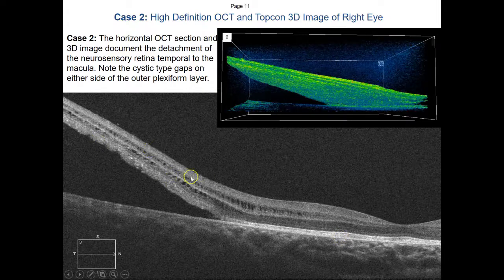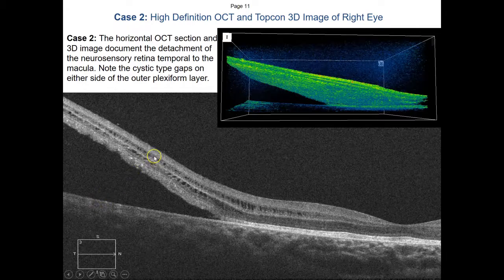So it's a macula-on retinal detachment. And these become emergencies because we don't want this to progress to affect the macula, where the macula would be off. In that instance, the prognosis would be worse. This one is a little bit different. Here we're getting a cross-section. We're actually seeing not a single separation. And this is at a high resolution, this one. But here's 9 layers of neurosensory retina separated from the retinal pigment epithelium over here.